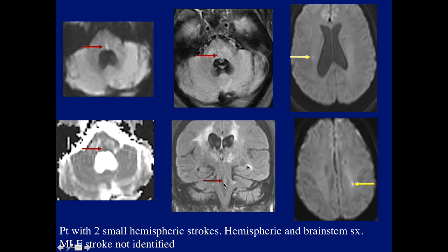And again, there's a lot of abnormality here, but do not neglect to mention the lesion which was in this location, which was appropriate for involvement of the MLF, which went more with the patient symptomatology than these hemispheric strokes.